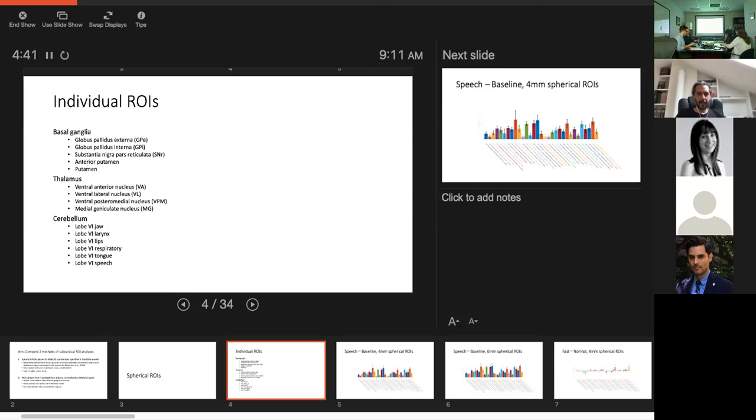As we go, we went so long without really doing a lot of ROI analysis, and now we're doing all the possible ones. Yeah.